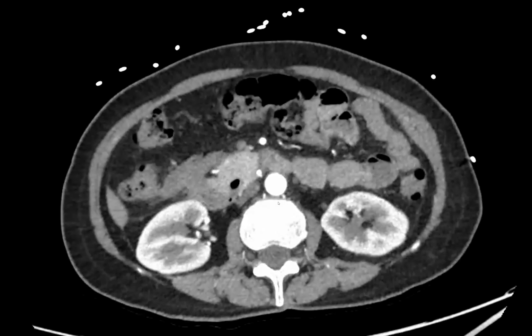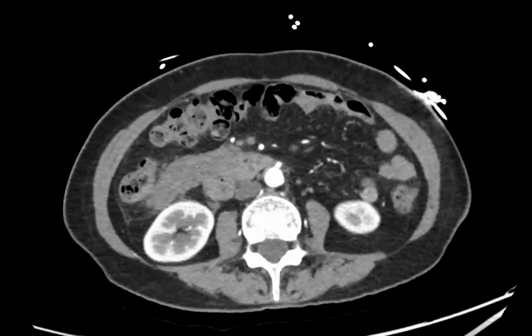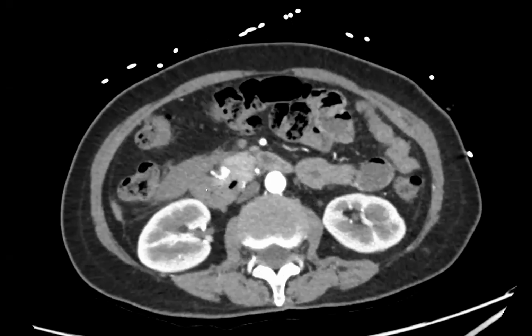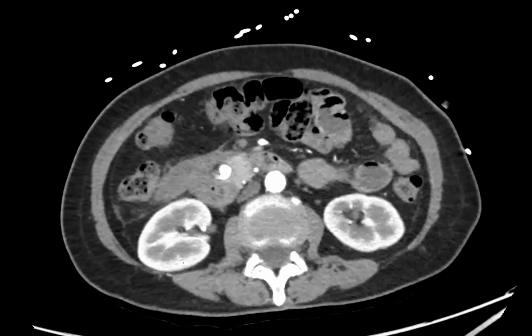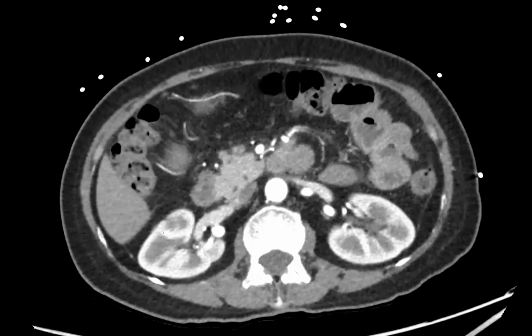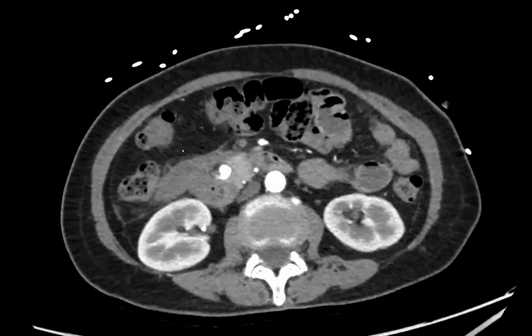First of all, we're not going to call this metastatic disease because, first of all, the rest of it has gotten better, and ovarian cancer doesn't usually go to the retroperitoneum, so that would be weird. And then on top of that, you've got this beautiful little pseudoaneurysm here, right? That we can even trace the input and output coming from the pancreaticoduodenal arcade and branches of the GDA. So we don't know what caused it.